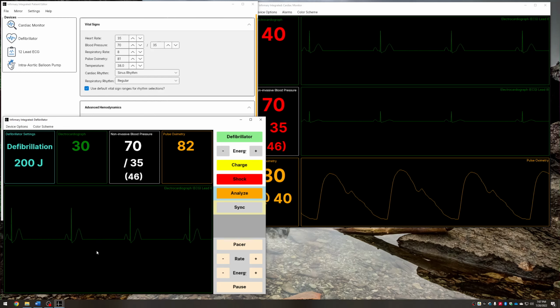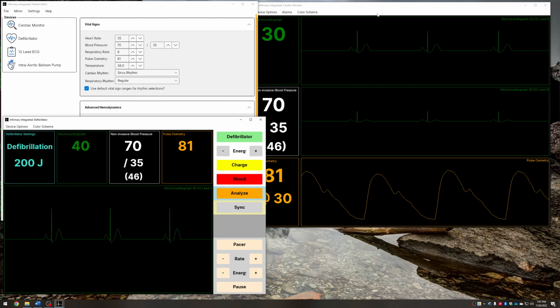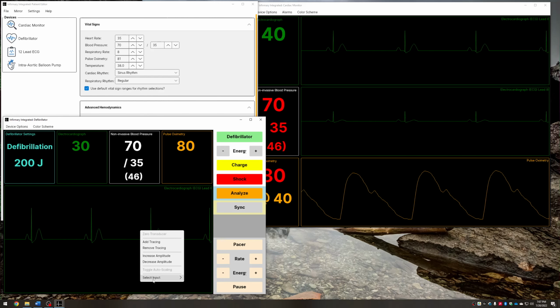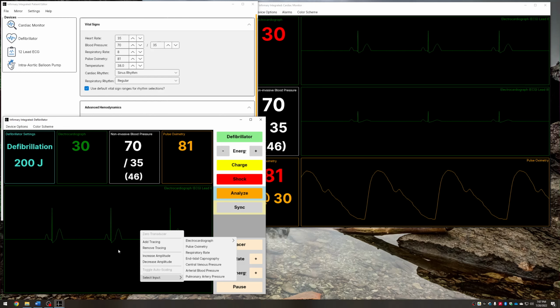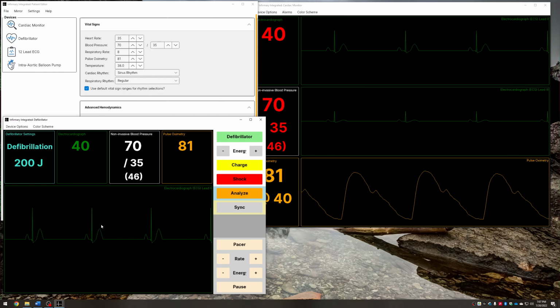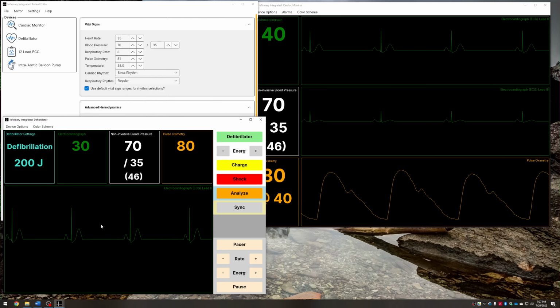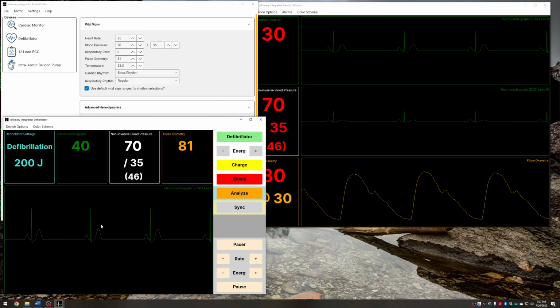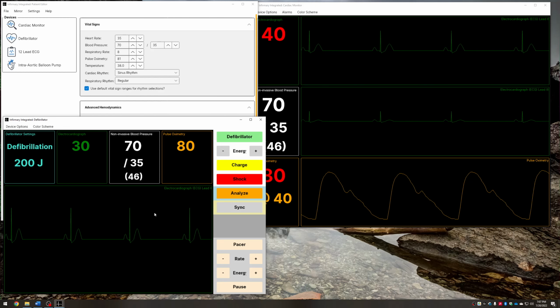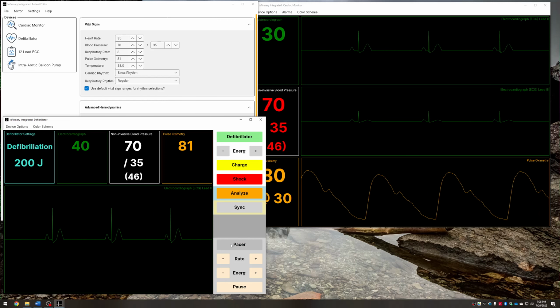And as you see, the waveform on the defibrillator on the bottom left of the screen matches the waveforms on the cardiac monitor. We can add some different tracings, such as really any of the tracings, but to simulate a basic defibrillator, this one's actually modeled slightly after the Zoll, well, actually the physiologic one, but it's a very generic defibrillator. It comes up with an EKG lead and a couple numbers. We can definitely add complexity to it, but we'll do that another time.